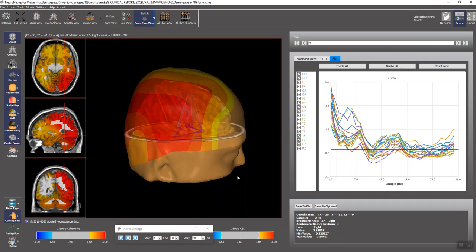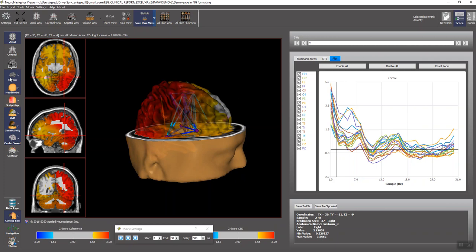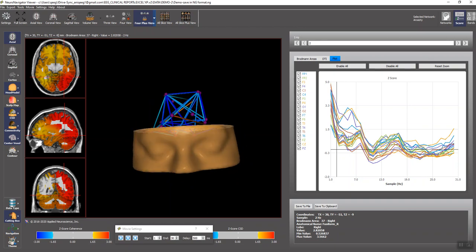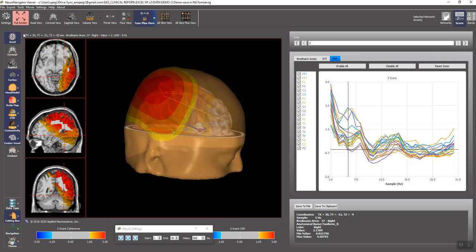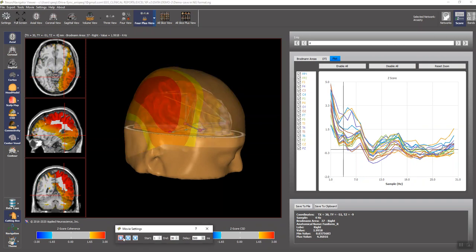And then once that evaluation happens, you can then launch the NeuroNavigator and go into greater detail as to the linkage of dysregulated networks to the patient's brain, and then march through these networks and the scalp and cortex of the patient, including running a movie, if you wish. For example, we'll start here, and then we'll run the movie that's down here.